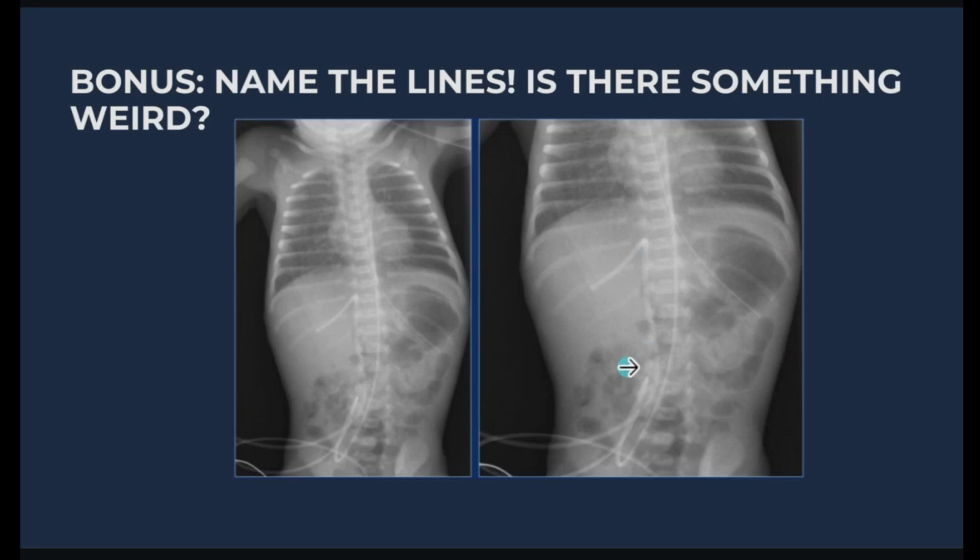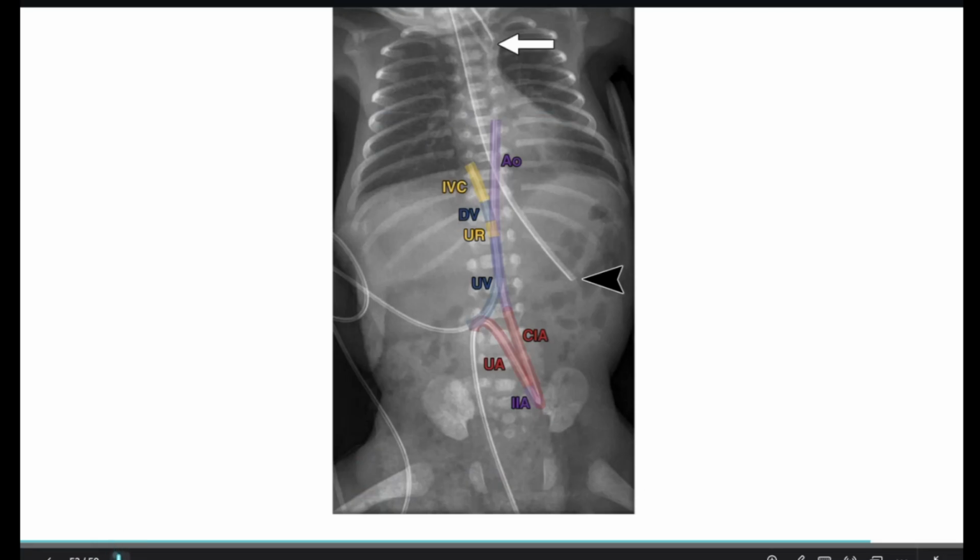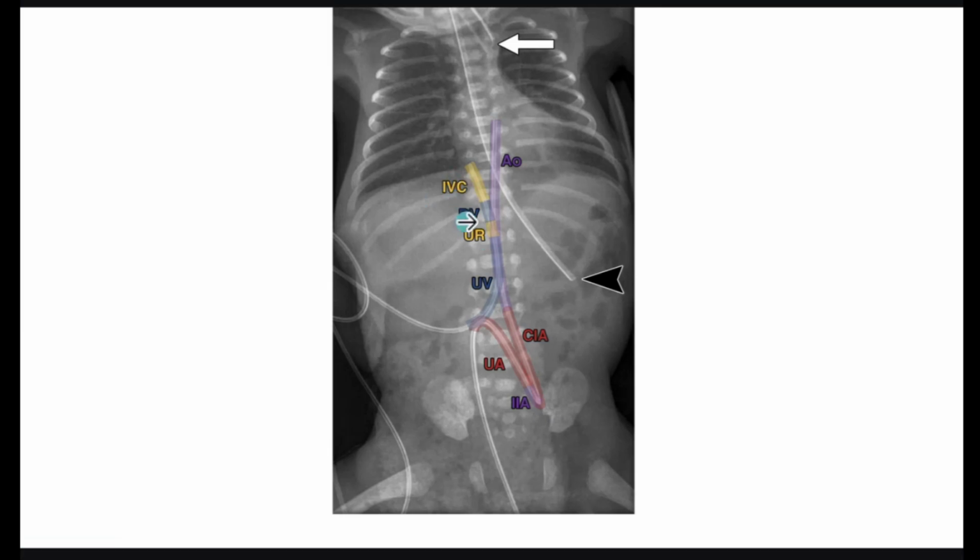And if you want to differentiate between the umbilical artery and umbilical vein, usually the one which is called up, I believe, is the artery. But yes, that's very good spotting there. Here's a picture again. So it should stop around here, as we mentioned before, instead of going into the liver. You can see the umbilical artery, which is slightly moving around, and then the UVC coming up here instead of coming into the liver, as we could see in the previous picture. And then here we could see the NG tube as well.